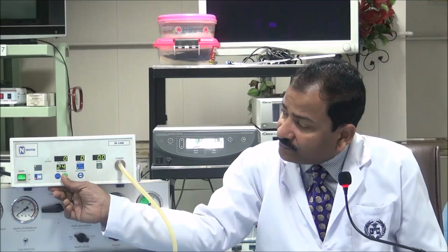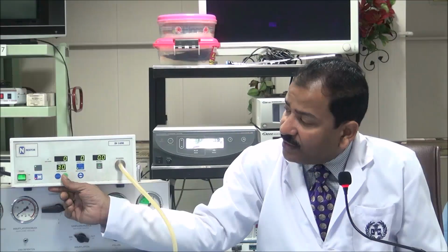Now, if you are doing some closed pocket surgery, like axilloscopy for breast augmentation, or saphenous vein surgery in the thigh, or vascular surgery in the popliteal fossa, in those situations you are allowed to go up to 30. You can consider that because it is not a pre-formed cavity. It's an artificial cavity which we are forcefully making, isn't it? So at 12 you will not have any space to work. So you can go up to 30 also.